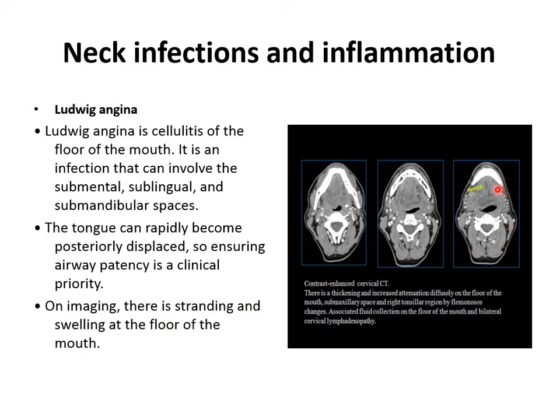On contrast enhanced cervical CT, there is a thickening and increased attenuation diffusely at the floor of the mouth, associated with a fluid collection and bilateral cervical lymphadenopathy.